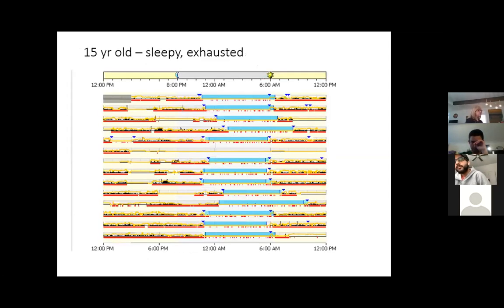Okay. So here's another one. The red bars are waking, and then these are epochs where she's probably awake. But to tell you the truth, this is probably something I put in. This one looks like the thing fell off, although there's two little marks there. You can make it look whatever you want by turning up the sensitivity.